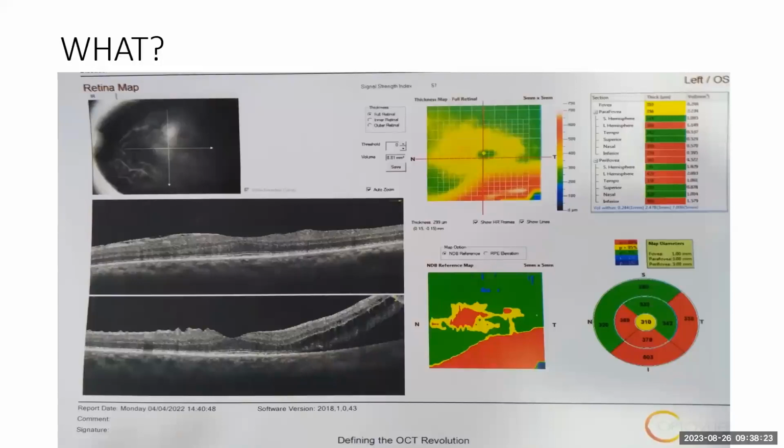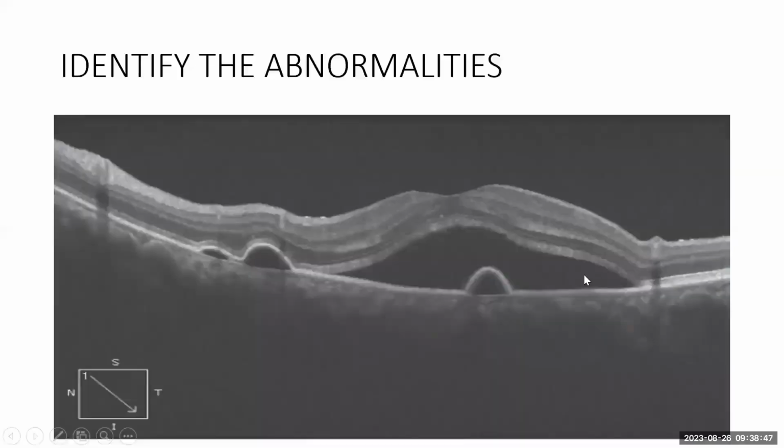So usually when you scan, the first scan here is from left to right. So it will not show this. This scan is from up, down. So it will show this. So on this scan, this is left, this is right. On this scan, this is up, this is down, okay? All right. Thank you for contributing. Thank you, everybody.